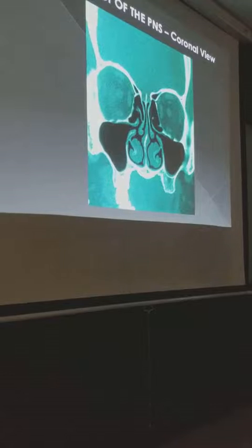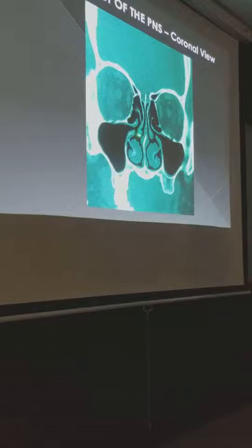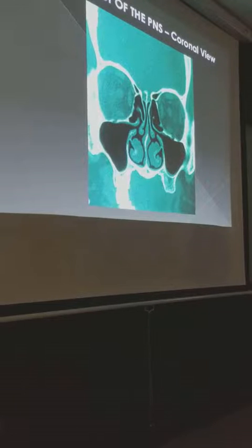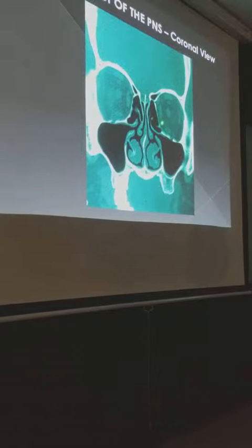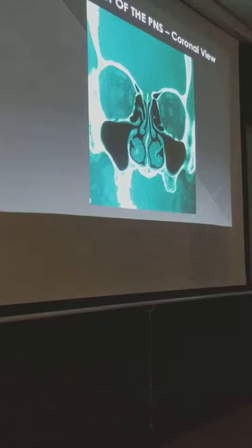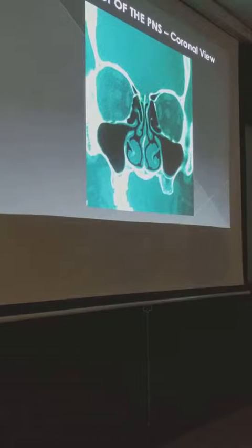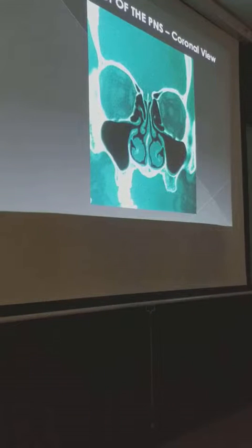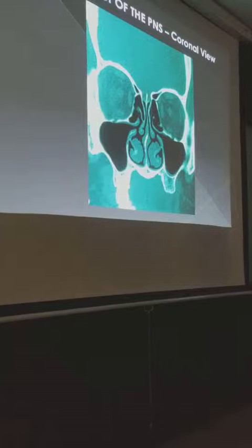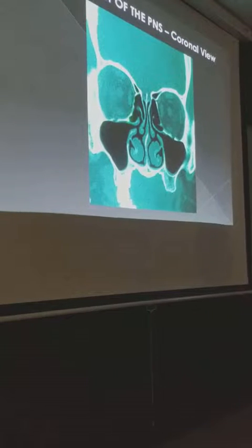See? When it gets to the osteomeatal complex, dikit-dikit. So it's basically the same. You have the uncinate, you have the sharp anterior cranial skull base there. This side, you can see the vertical lamella is still attached directly across the lateral lamella, but it is now transitioning into the second lamella. And what is the direction? Oblique. Saan pupunta yan? Dito.